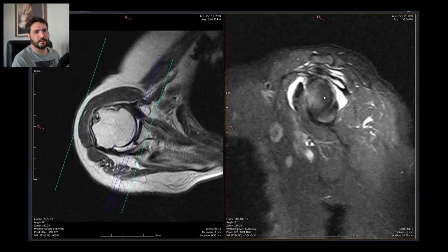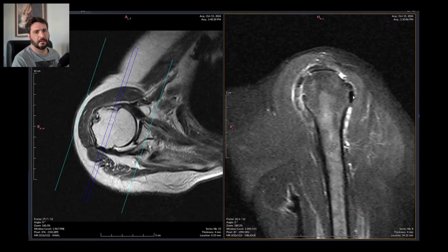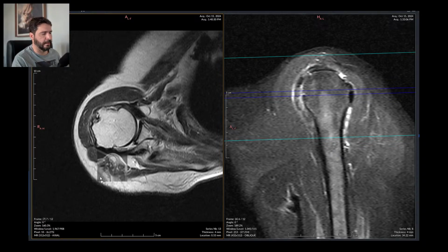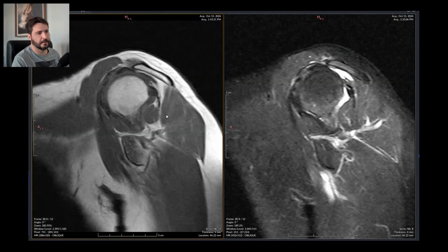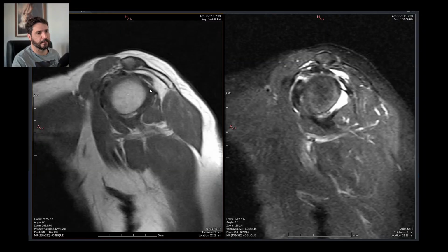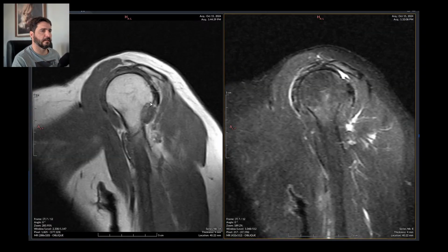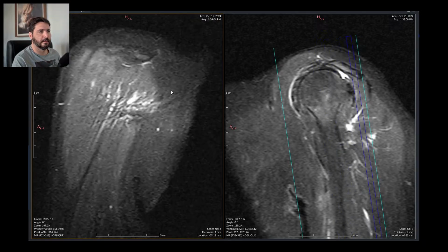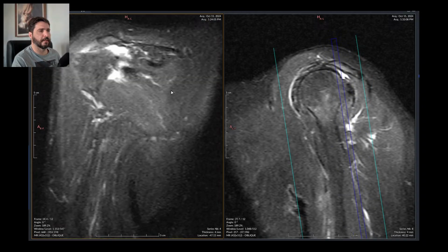It's gotta be the supraspinatus, the infraspinatus, and this is surely the teres minor right there. I can see it's missing here, and it's too crooked. But this is the infraspinatus, this is the teres minor, and the infraspinatus just finishes around here somewhere. It seems to be indeed ruptured. So let me see if I can put my marker there and make an educated guess.